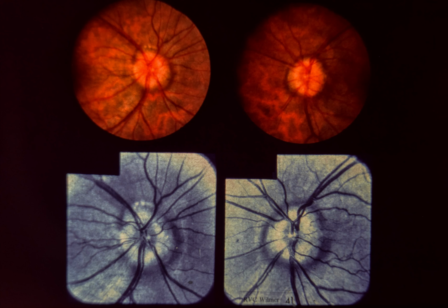Despite a normal neurologic examination, the patient underwent skull X-rays, EEG, brain scan, cerebral arteriogram, and ventriculogram, all of which were normal. A diagnosis of pseudotumor cerebri was made despite the absence of elevated intracranial pressure, and the patient was started on systemic steroids. When his ophthalmoscopic picture failed to change after a course of steroids, the patient was referred to the Wilmer Institute. Lower left and lower right.